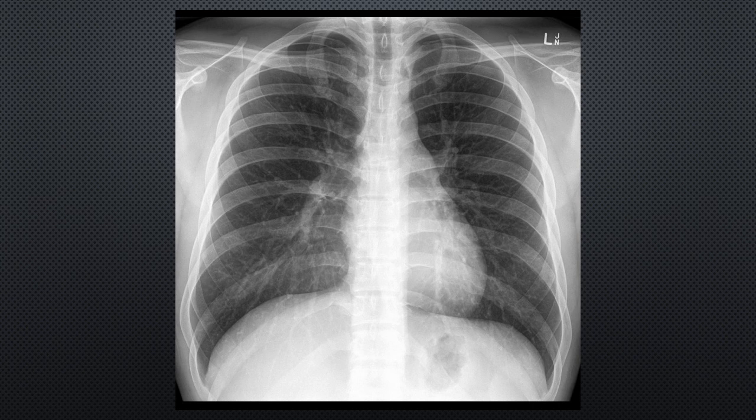It's a PA, posterior anterior film, and you can see that the shoulder blades, the scapulae, are moved all the way to the sides. You've got good exposure here, and you've got good inspiration, so you can count the ribs, and you can see there's 10 ribs here. So those are up here: 1, 2, 3, 4, 5, 6, 7, 8, 9, 10. And you've got good penetration, so I can see the vertebral bodies here behind the heart, and exposure is excellent.